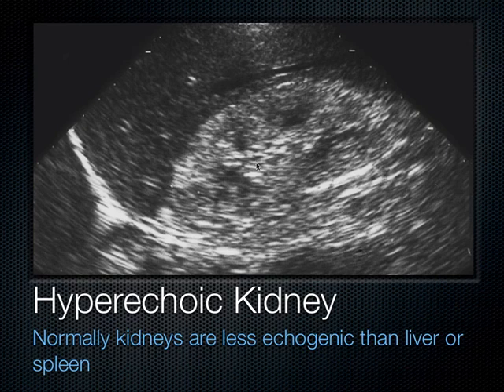Remember the cobblestoning that you saw a few slides back? The tissue looked very hyperechoic, very bright there. And that happens when you have infection. Things get more echo bright or more hyperechoic.